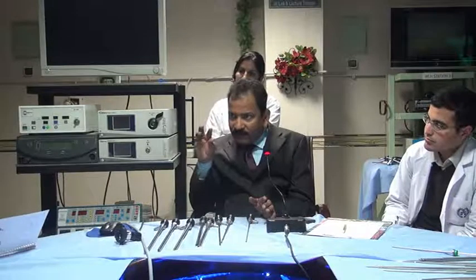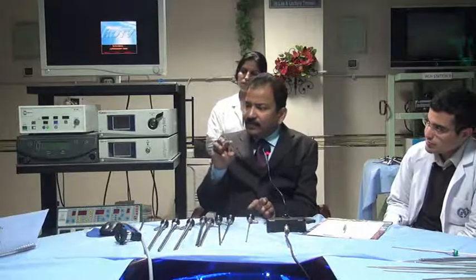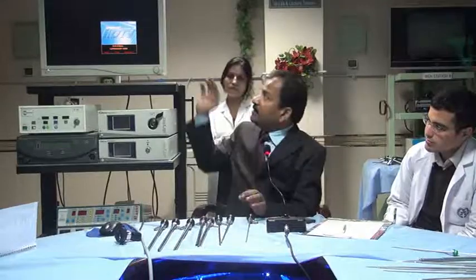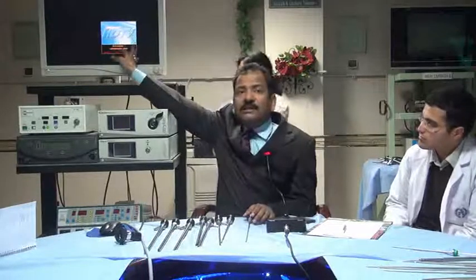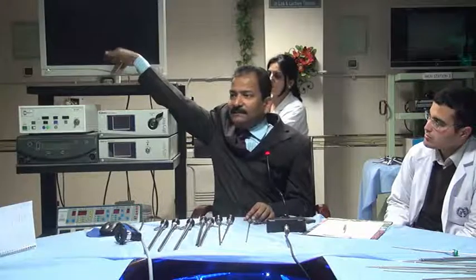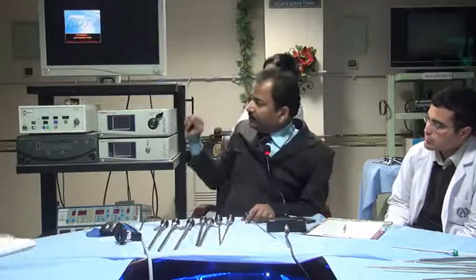A smaller field of vision. Field of vision will be small. It's not restricted. If you want to move in other directions, you can. Field of vision means your monitor will not get full screen. You will get it only in the central region. So I will show you.